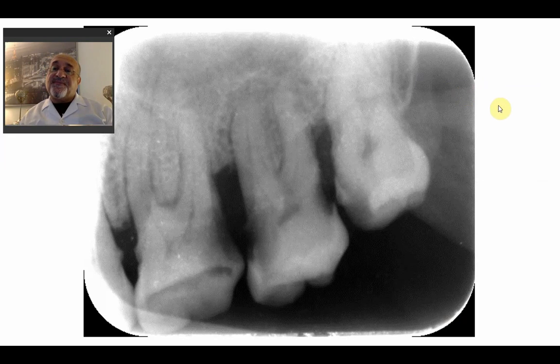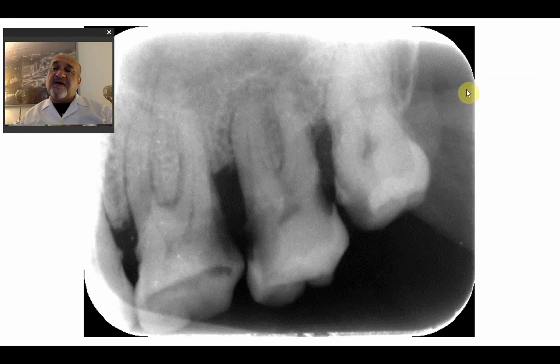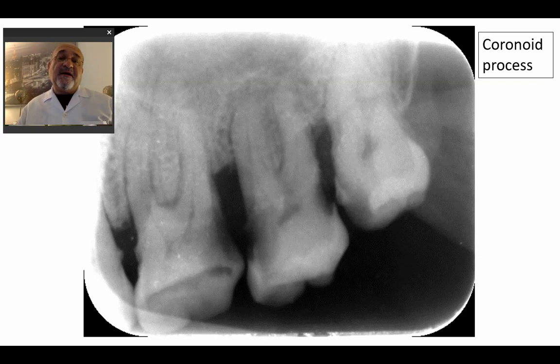See how big it is. It has covered almost the whole area. So please don't get mixed up by this appearance and misinterpret it as a disease entity. This is one of the strange things, that the image of the mandible's bone structure appears on the maxilla.